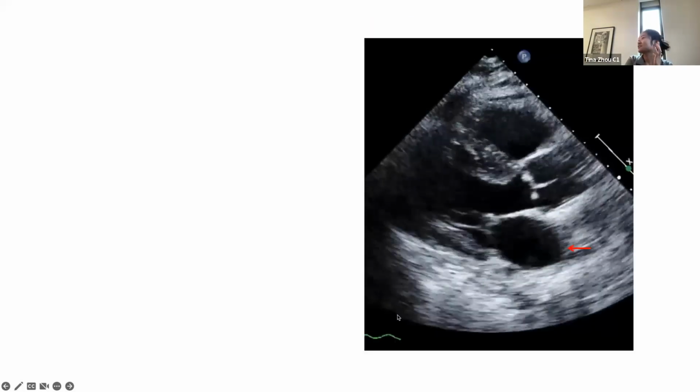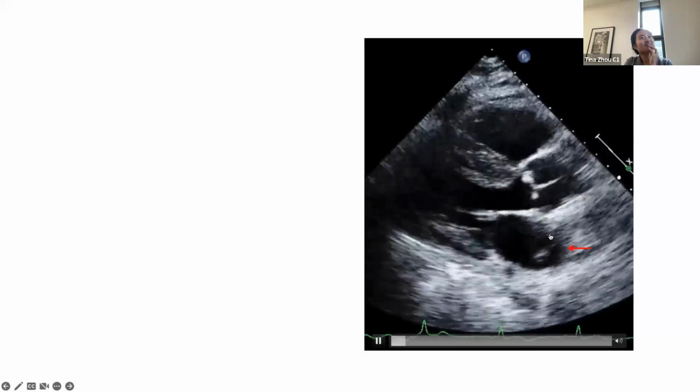All right, that's enough embryology for now. Moving on, what are we looking at here?